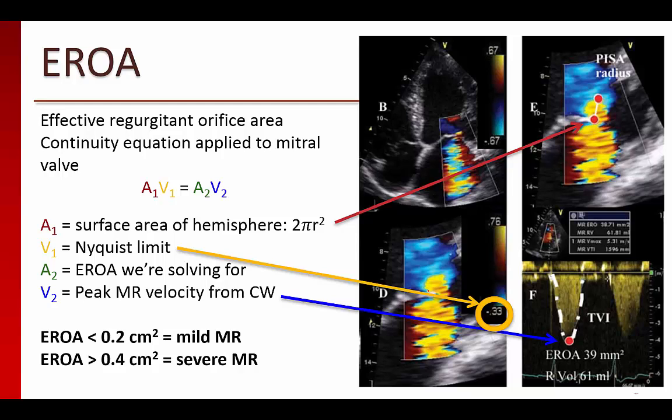First, the method assumes that the regurgitant orifice is round and that the PISA shells are perfect hemispheres, both of which may or may not be true. Also, the PISA method is inaccurate with multiple or eccentric jets. Note that the images to the right show this technique being used in transthoracic echo, but the same concept applies for TEE.